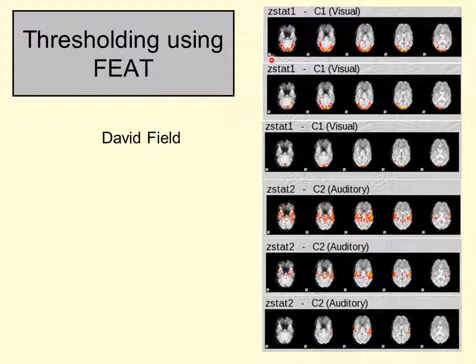The top image has the most liberal threshold, the middle image intermediate, and the third a strict version of thresholding in which family-wise error is strictly controlled. In this third image there are far fewer red and orange areas, which are the voxels declared active, than in either of the above two levels of thresholding.